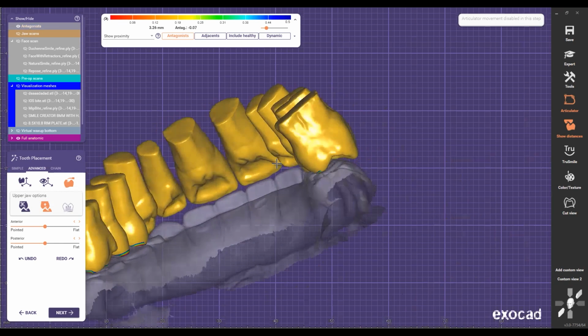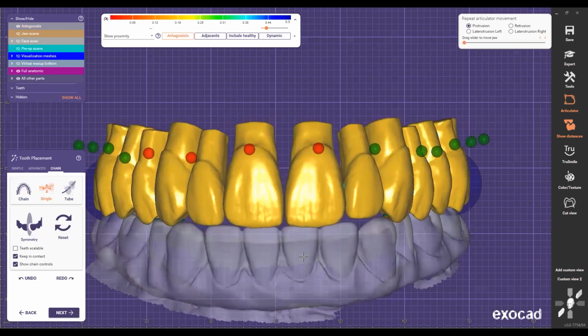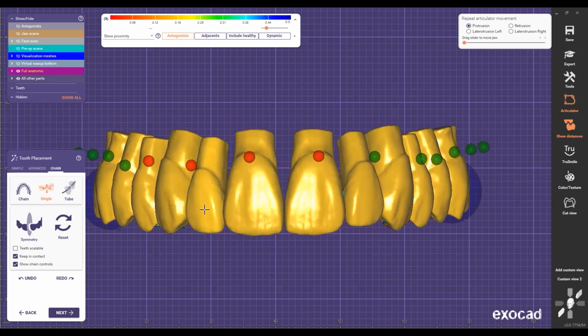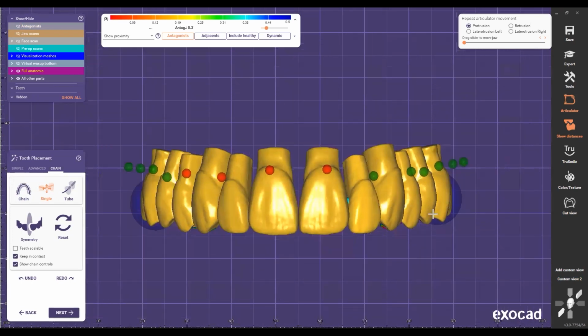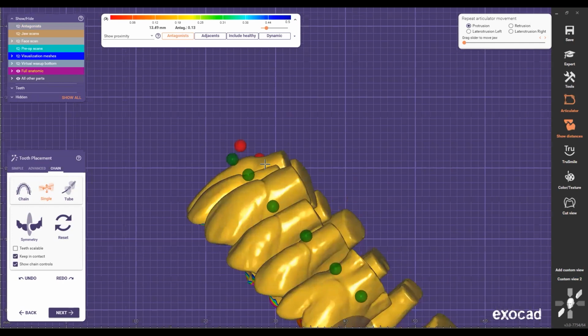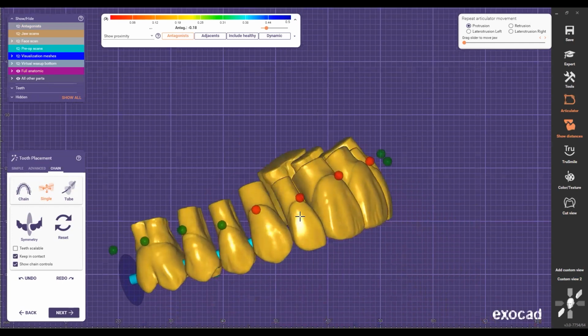So now here I just go to this one. Now since I have this already fixed, I'm just gonna try to change the angulation of this tooth here so everything follows in a nice curvature. Everything looks good there. Now I'm gonna go and bring this lateral down right there, and follow a nice inclination of this lateral. So I'm gonna just bring it out more, and I just start checking different views to make sure it looks good here.